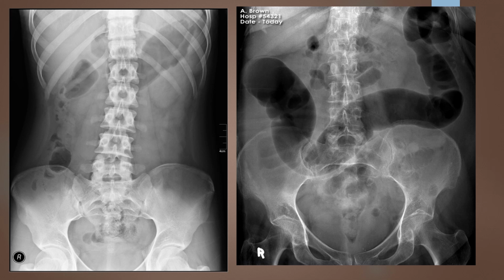It's not. So the tech clipped the top and the bottom. Usually a tech's worst nightmare, because now not only do you have to repeat, but you have to repeat at both ends. So this one is going to need to be repeated, or it is at least going to have an 8x10 bladder shot added and a crossways image of the diaphragm.